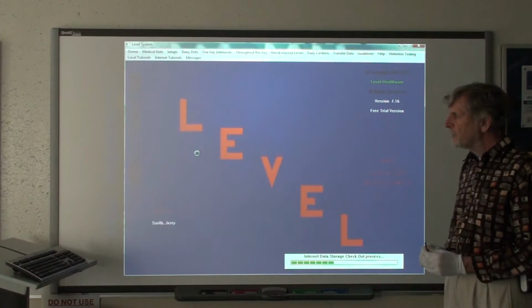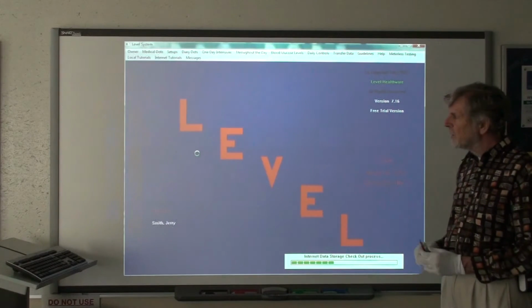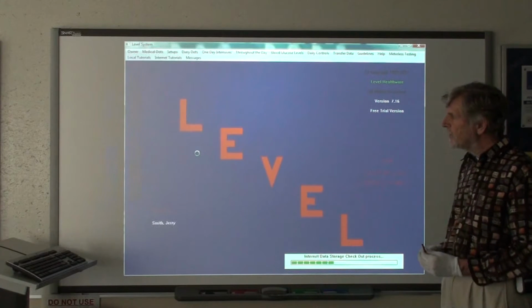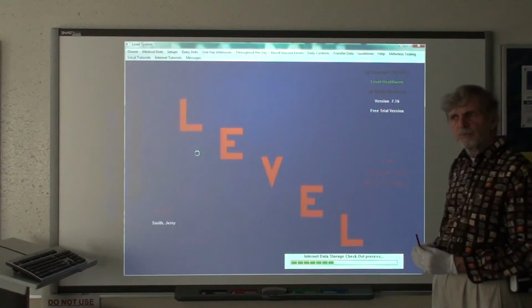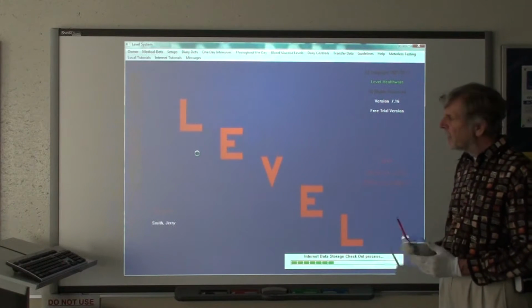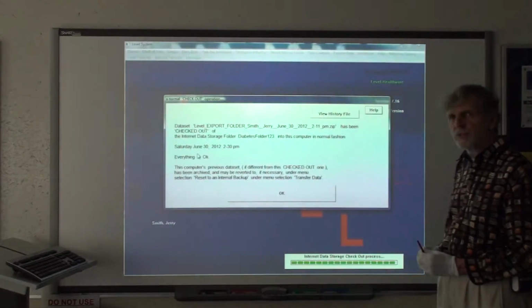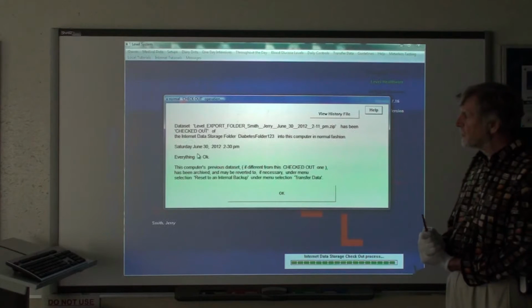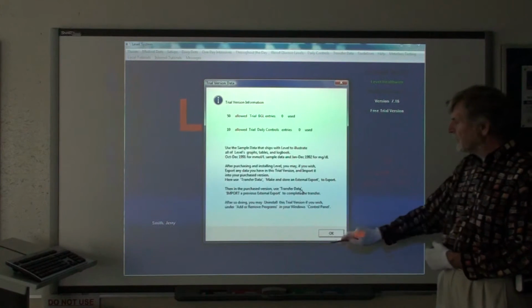The other advantage is that the environment in which you are looking at it from is your computer program. This means that you have access to large, fast, powerful algorithms that can analyze the data for you in depth and make complete presentations of it. So now we have checked out his data set from internet data storage, where he himself put it. It's now present in this computer, and we can continue.